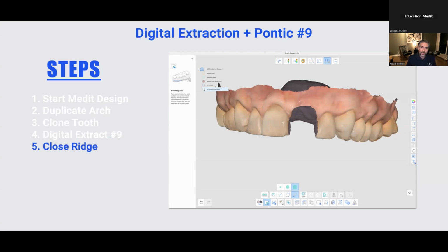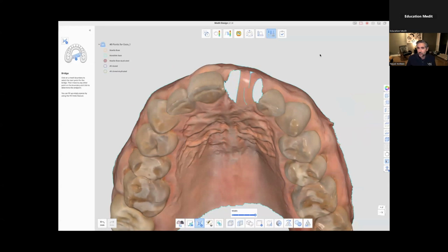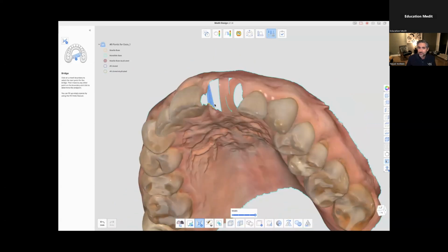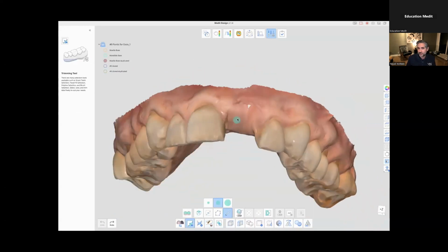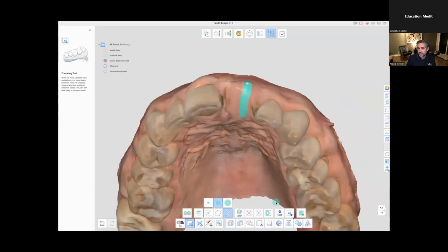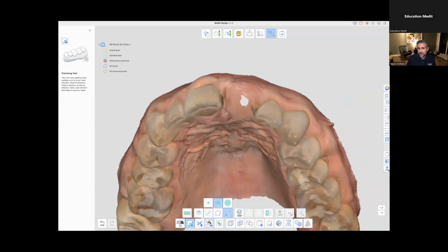What we're basically going to do is close this using, again, still in edit mode, something called the bridge tool. So I'm doing some bridges here, basically connecting one part to another, because the hole is too big to just close on its own. Now I'm going to try to fill the hole. Okay, filled the hole. Sometimes you have a little bit of an error or a problem. So what you can do is just delete that area, select, delete. Now you can go back and bridge again and close that. And sometimes after that, you still have a little area, so you can do it again and close it.